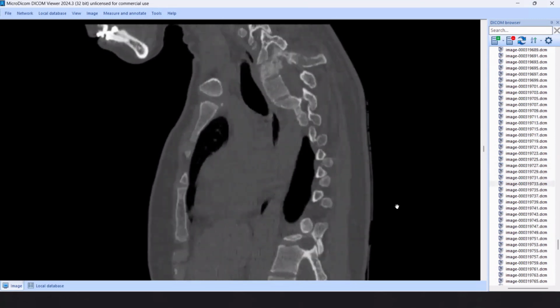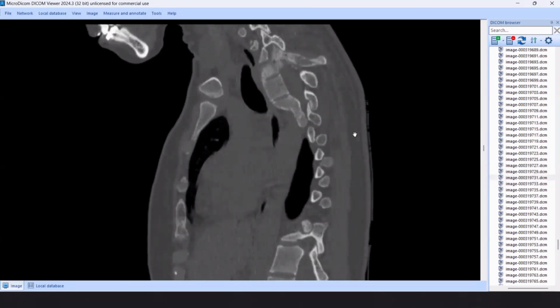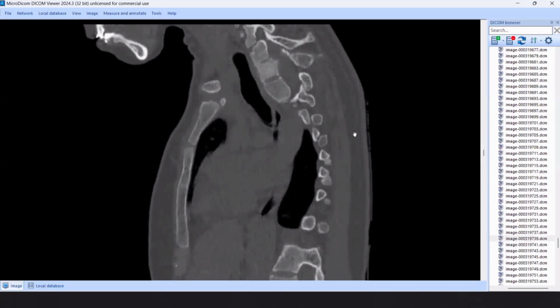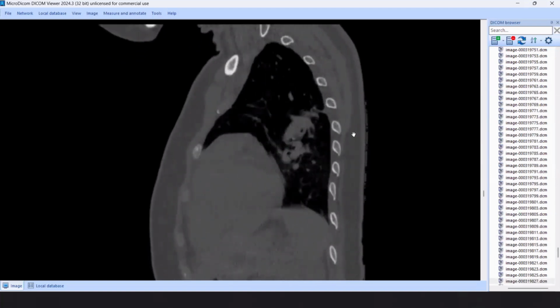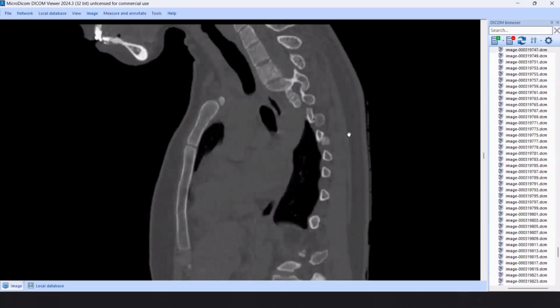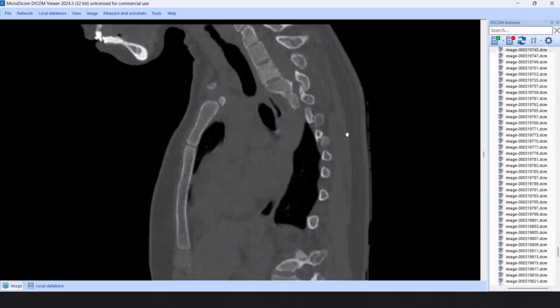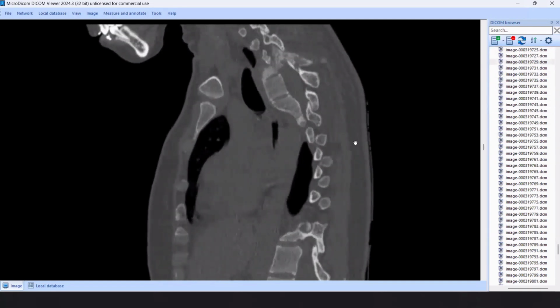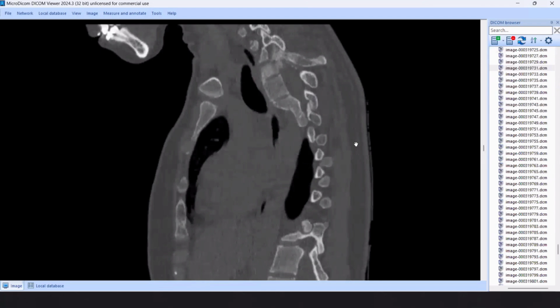Same idea, there are heterogeneous, predominantly sclerotic upper two vertebrae. I can't determine the dorsal level, but probably this is the third. Okay, third. If you count the ribs, you will find this one is the third vertebral body. And I agree with you that the third vertebral body here appears heterogeneous sclerotic. I think the one above it also, but I'm not sure. The predominant one is the third, and in this vertebra, I think the element also has the same appearance.